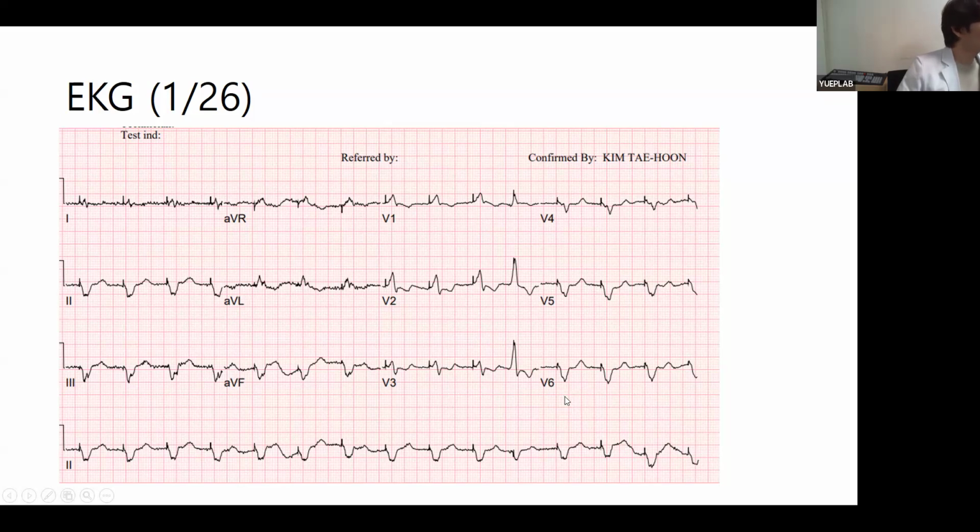And is the QRS width less than 120? It varies according to the patient, underlying conduction property, heart size and native QRS duration.